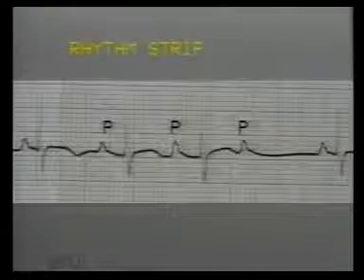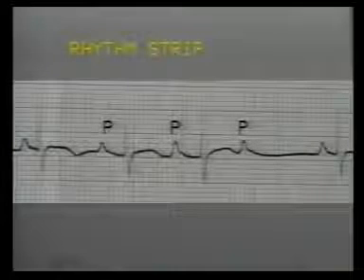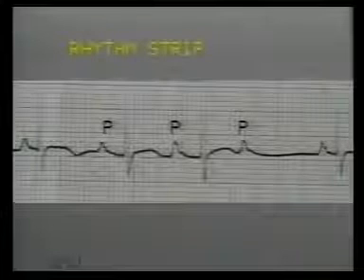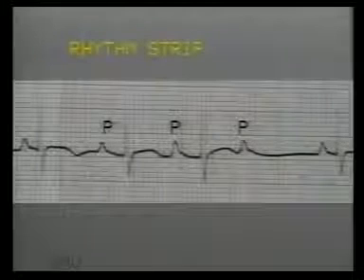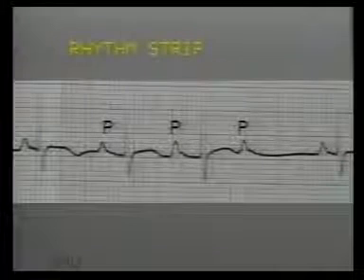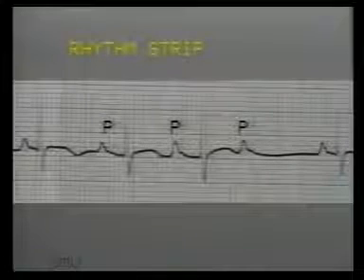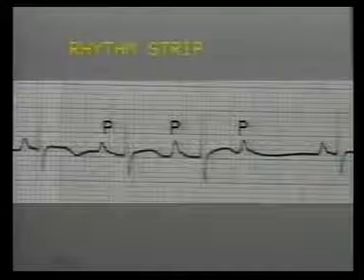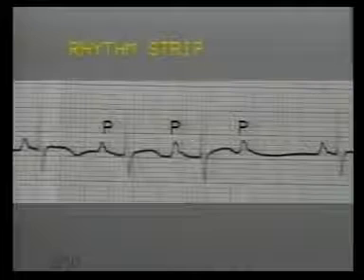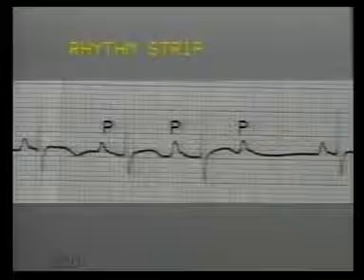After studying the PQRST pattern, we shall study the rhythm strip, calculate the rate, and inspect grossly for arrhythmias. First, see whether normal P waves are present. Study the P wave and PR interval, whether the PR interval is increased, whether it is constant in all the beats, and whether every P wave is followed by QRS complex. Are the QRS complexes of normal configuration or bizarre? And are they related to the P waves or have their own different rhythm?